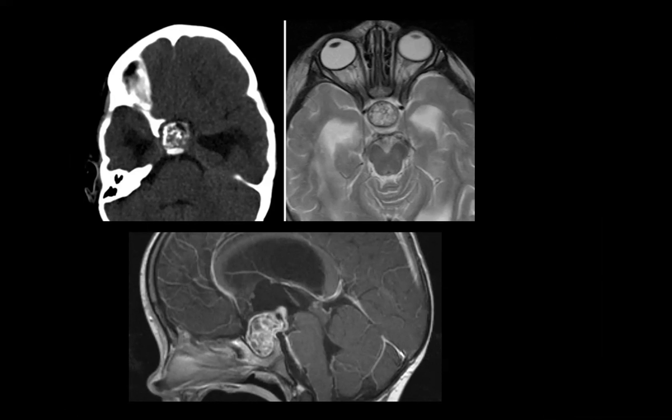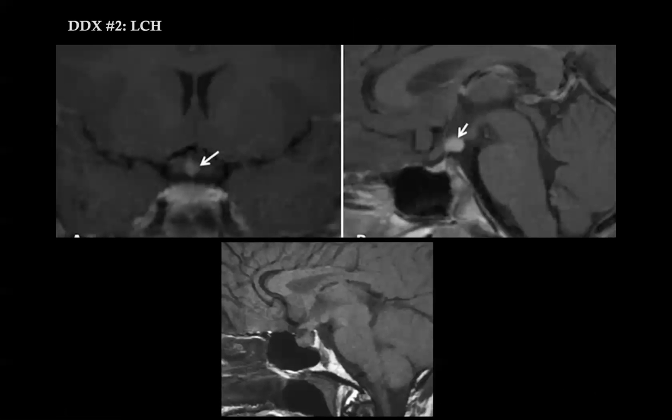You can have hydrocephalus, so don't forget to report all the findings. So look at the calcification. Most of the craniopharyngiomas have calcification, and this is very, very helpful for the differential diagnosis. And another differential diagnosis will be the optic pathway glioma.